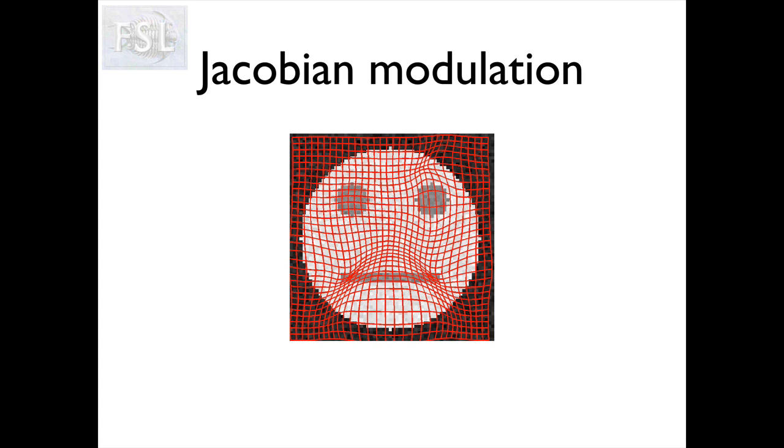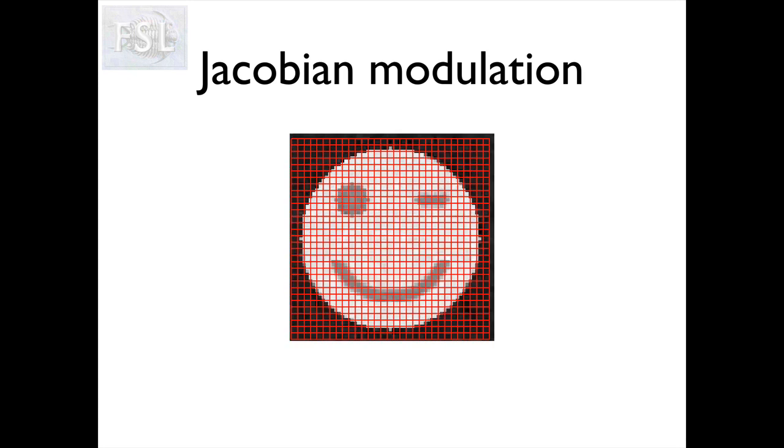Going from that image to that image, we can perform with a nonlinear registration. But one of the things you will see is that the amount of grey which was in one of the eyes has substantially changed between one image and the other. We need to take account of that if what we're interested in is volumes of grey matter in our analysis, which is what we're trying to do in VBM.